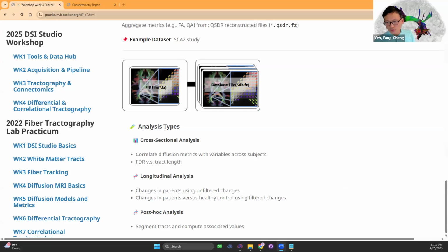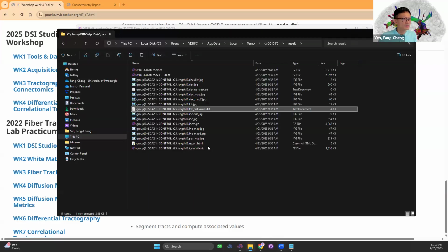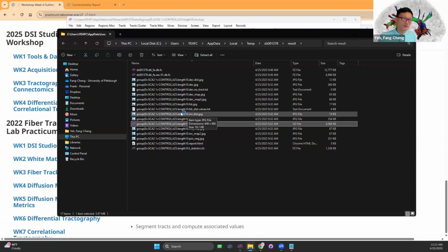There's a question: can you extract connectivity matrices for each subject with a track showing difference? Yeah, you could do that. I would say that's a good scenario. Say, if you have a finding, say for example, the one with the results we got here. This one we tested the cross-sectional difference.